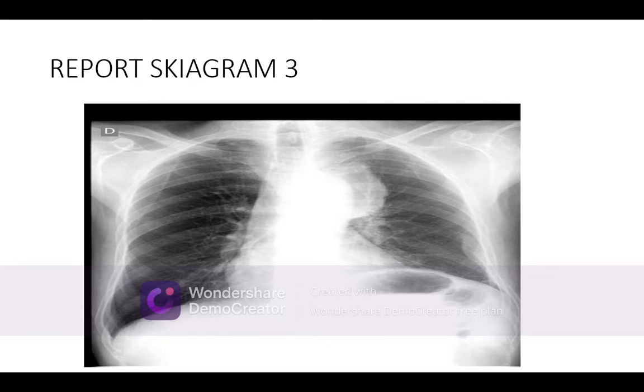It is a PA view, yes, because the spine is masked. The second one, S: it is standing, yes, it is standing. First rib, second rib, third, fourth, fifth, sixth; the right dome of the diaphragm is at the 7th, so the patient is standing. Next, it is straight to the spinous processes. Make one line here through the spinous process, and draw another line at the upper part of the lateral joint. There are 2 lines now, 90 degrees here, 90 degrees here. If these are at 90 degrees, it means the patient is in a straight position.